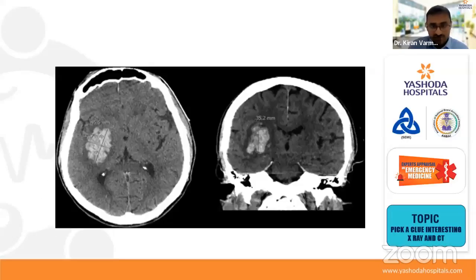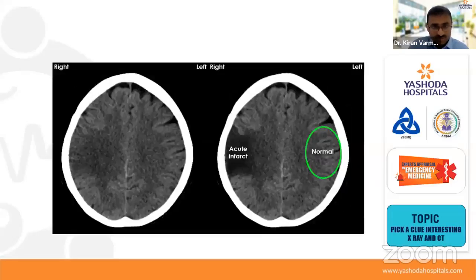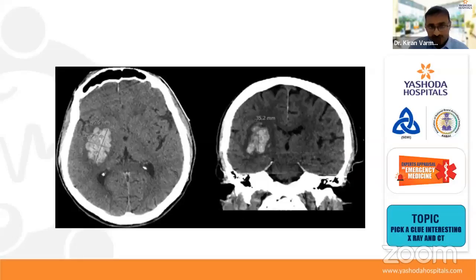Ischemia and bleed? Previous slide. This is ischemic stroke. Next slide. Then this is hemorrhagic. Based on that, the treatment itself will differ. If it is ischemic, treatment is different. Hemorrhagic treatment is different. So you should know the difference. Next slide.